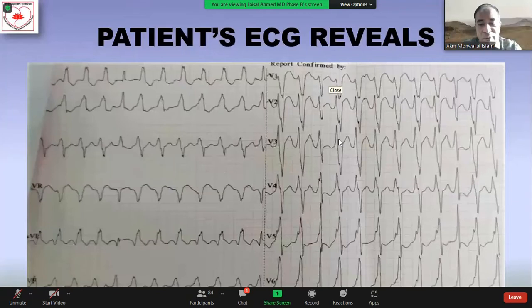In this particular case, I think that the diagnosis can be directly made as ventricular tachycardia, because the presence of capture beat or fusion beat along with AV dissociation are the telltale signs of ventricular tachycardia. But if they are not present, then probably regular wide complex tachycardia should be the first working diagnosis, with the differential diagnosis that has already been mentioned.